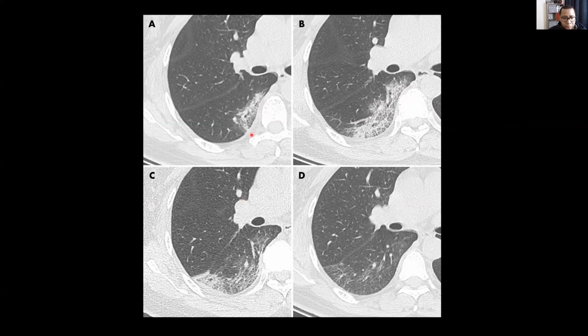So this just shows you some progression, starting off with really ground glass opacities and some consolidated opacities. And a few days out, I believe this is 3 days and 7 days, you have more extensive ground glass, some crazy paving, some more consolidation. Okay, and then 11 days, as things were getting better, right? You have some more band-like ground glass, some new area of consolidation. And then by about 20 days, as you can see, there's just some faint ground glass and some band-like opacity. So probably some residual scarring at the time.